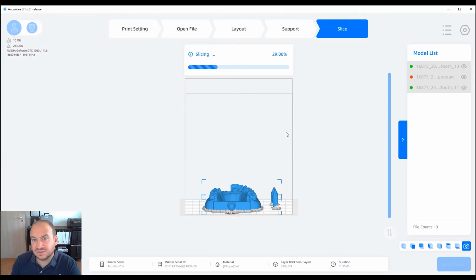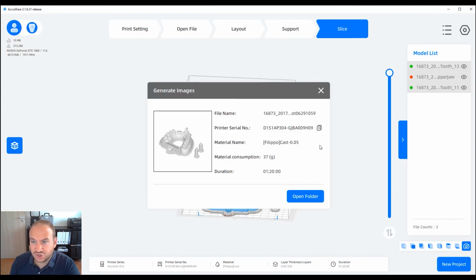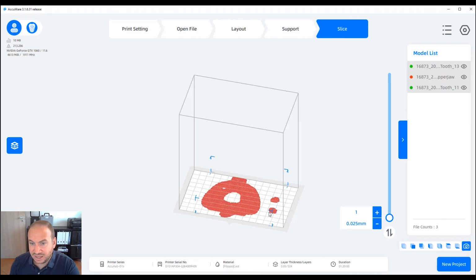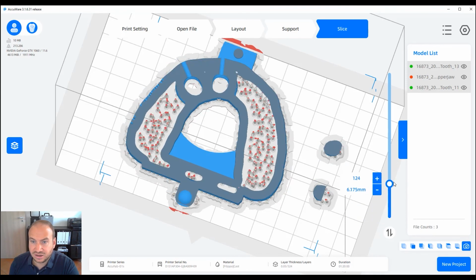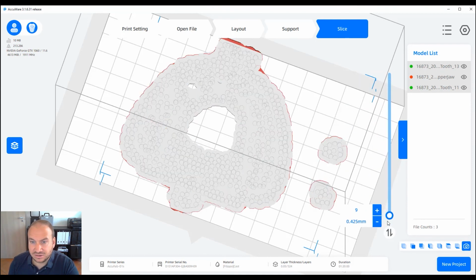The last suggestion that I would like to share with you is related to the first layer, which, as I said, is the most important. Once the file is generated, what I recommend is to check the first layer. So go to 0, press plus, and check if there is something in the first layer. Yes, we have this picture that will be replicated in the projector or in the LCD monitor. Just to be sure that the first layer is present, and that the print phase will start correctly.